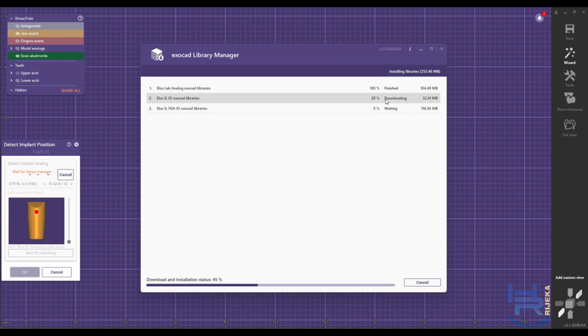So in this case, if it happens again with this other object that's downloading, it'll apply the same answer, meaning it will replace the entire thing with the new version. And then again, it'll replace the entire thing with the new version of this third item that's currently downloading. So this is almost finished, and it just replaced that as well.